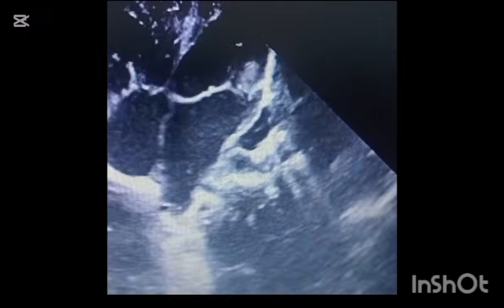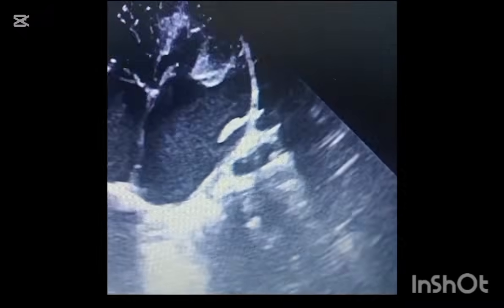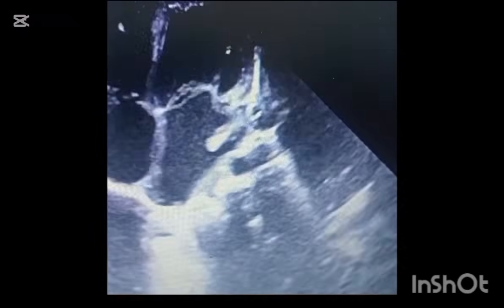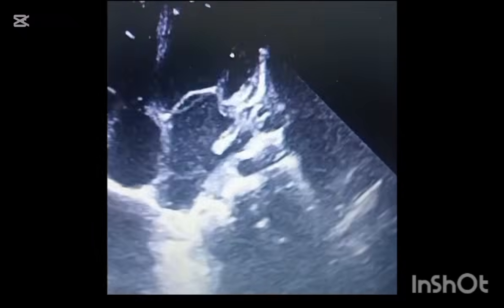This is not a disease or caused by Coumadin. It is an embryological remnant that can look like a mass or clot on echocardiography, leading to misdiagnosis. But advanced imaging confirms it is a benign part of the heart structure.